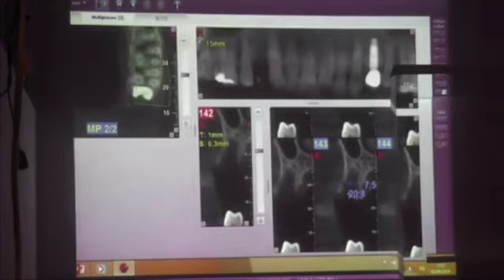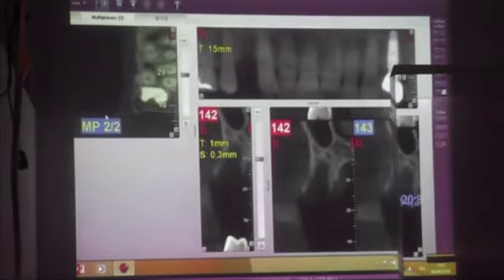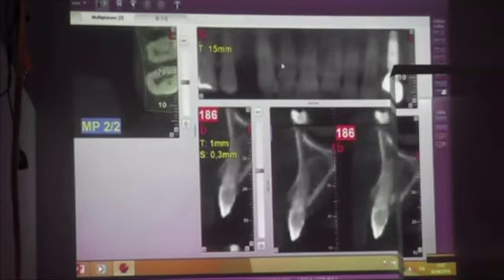And it's very easy to use this system, because when the system is complex, the doctor needs to learn the software. It's difficult, but we have the imaging to increase or reduce. The imaging is the same. We can change the position in a very easy way. I can measure.